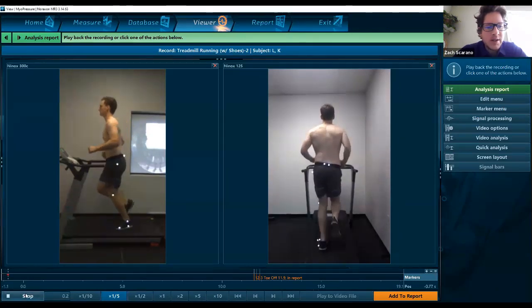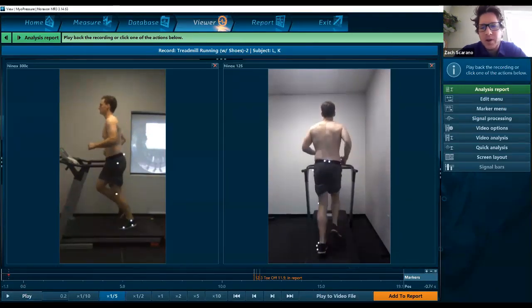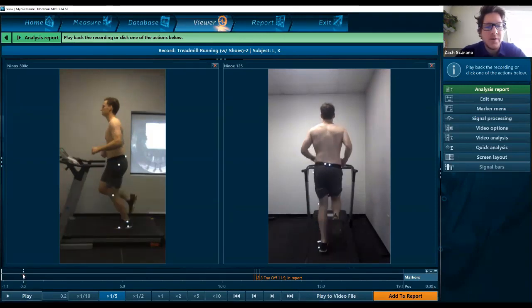So we'll go ahead and stop the video, and typically when you're applying drawings, you want to start from the first frame or the 0 frame. One thing that you can also do is if you even begin your videos perhaps with the person stationary, you can ensure that they're in the same position every time, and that's always going to help for a better marker tracking experience, just in case you want to use some of the layouts, which we'll talk about here in a second.